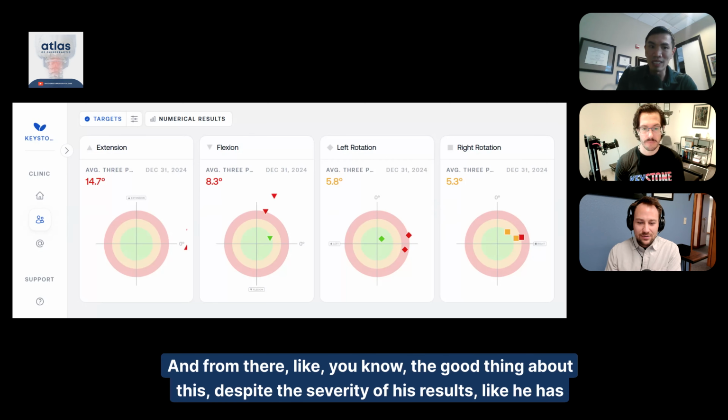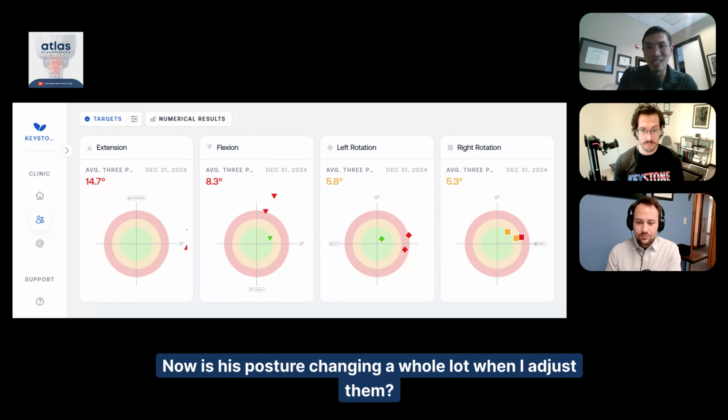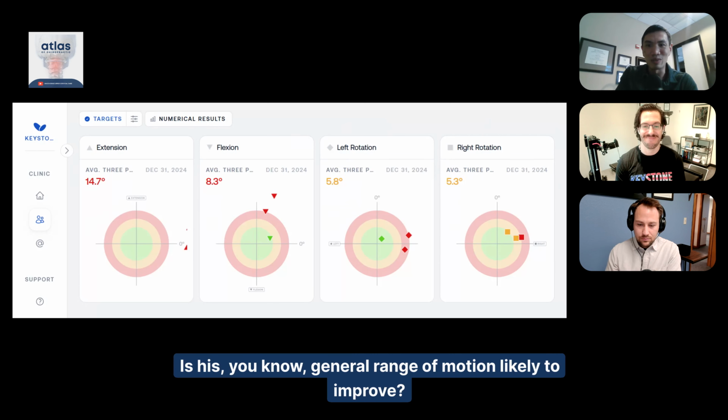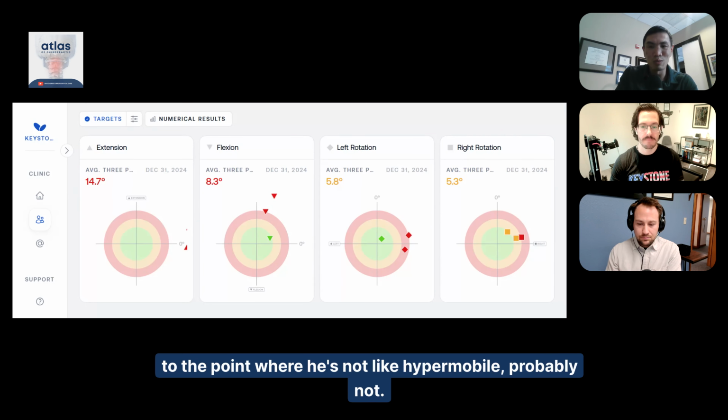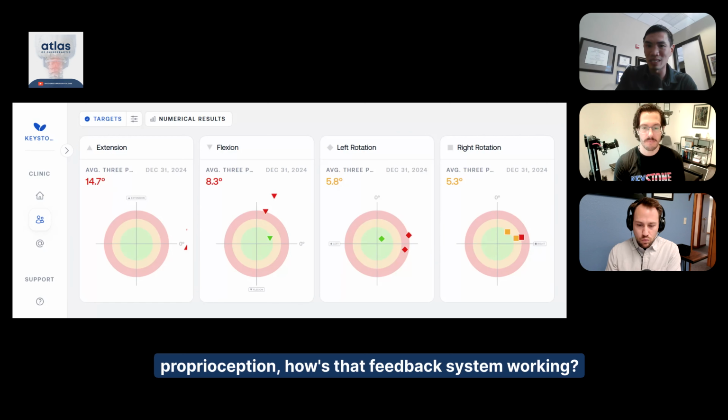And from there, the good thing about this, despite the severity of his results, is he has responded really beautifully to getting adjusted. Now, is his posture changing a whole lot when I adjust him? No. Is his general range of motion likely to improve to the point where he's not hypermobile? Probably not. But I am interested in seeing, when we test this on him next week, how his cervical proprioception, how that feedback system, is working.